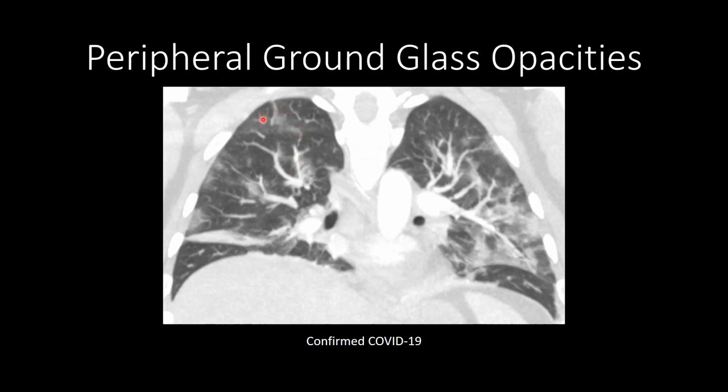Again, a case of confirmed COVID-19 that's relatively severe, but notice predominantly we have peripheral, patchy ground glass opacification with some areas of developing consolidation.